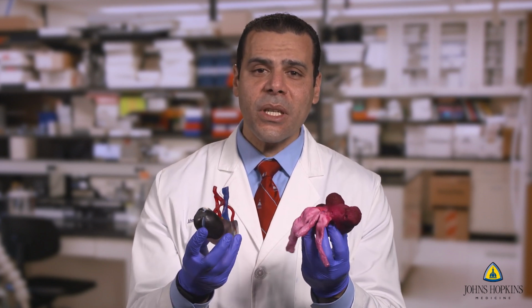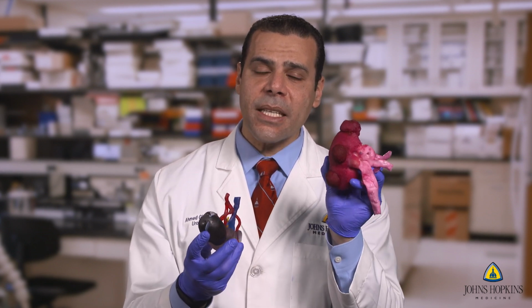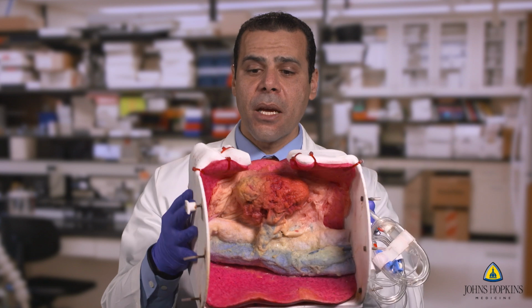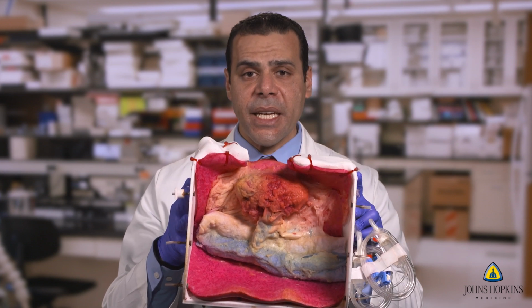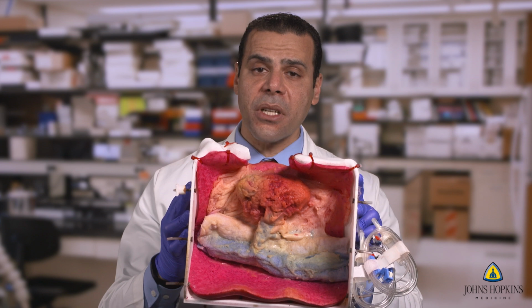But if we give a surgeon just the kidney itself to cut through, that's really not a true immersive realistic experience. What we needed was to place the kidney within the context of the abdominal cavity. And so we created an abdominal cavity. We took patient CT scans and developed this, which is almost half the patient's abdominal cavity, with the 11th and 12th rib all the way down to the iliac crest, with all the bony and muscular landmarks, and the inferior vena cava, the kidney, the surrounding fat, and the muscle, all in hydrogel format.